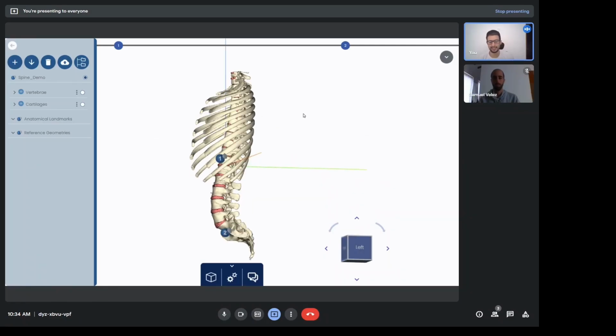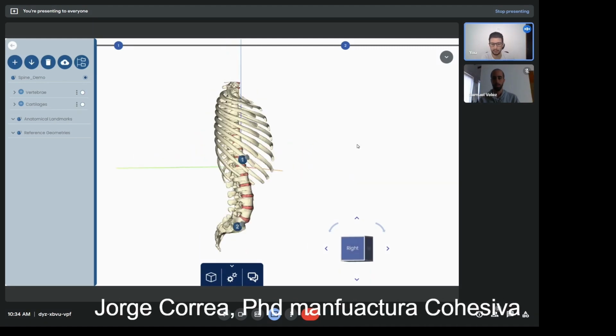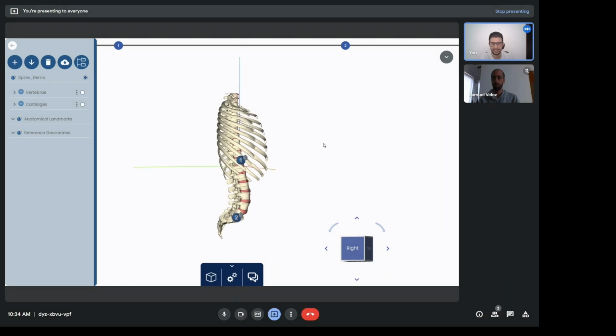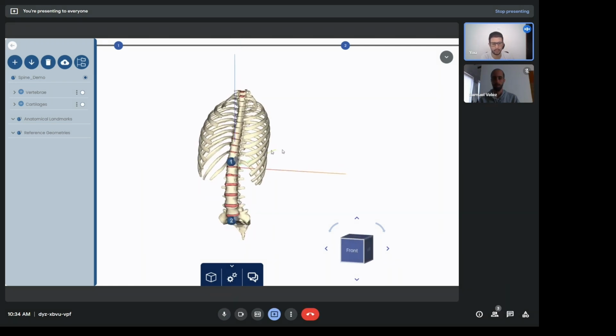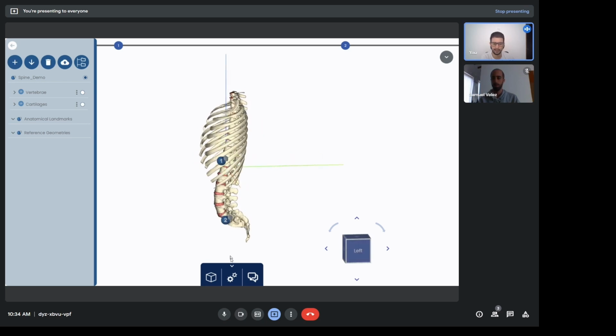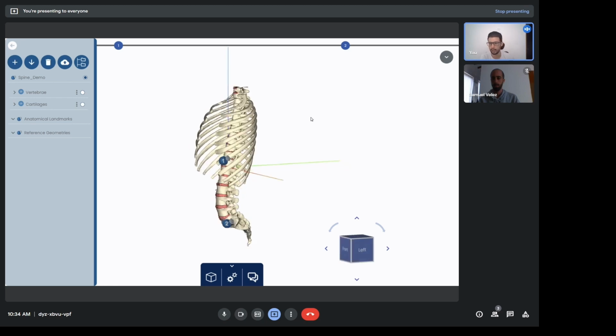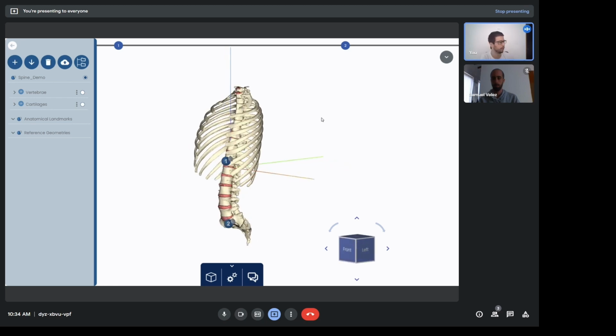Welcome. This is a very casual conversation on how to use some of the highlights, details, and features of the DISRP tool by TechFit. We are showcasing a vertebrae example. We're just going to show you some of the basic usage and tools. Samuel here is with me.